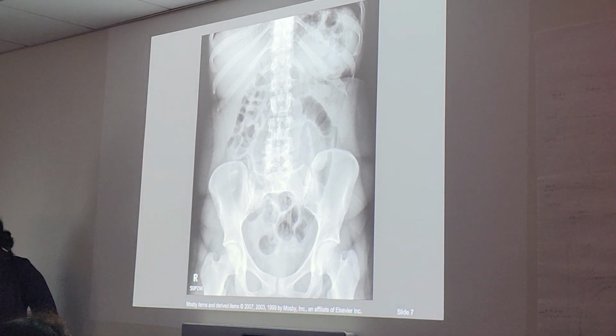All right, how about this one? This looks more like a digital marker. It's still too light. It's too white? No, I think the contrast is good.